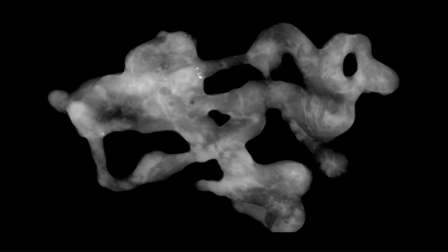So again, these are subtle. If you didn't see them, maybe you didn't spend enough time on the full pixel resolution images. Remember that when you look at the full pixel resolution images on the workstation, you have to be really concentrating as you go over each millimeter of breast tissue. You're not seeing the whole breast when you're looking at full resolution. You're looking at a little part of the image, then you have to move it over and look at another part of the image, and you have to concentrate as you do this.